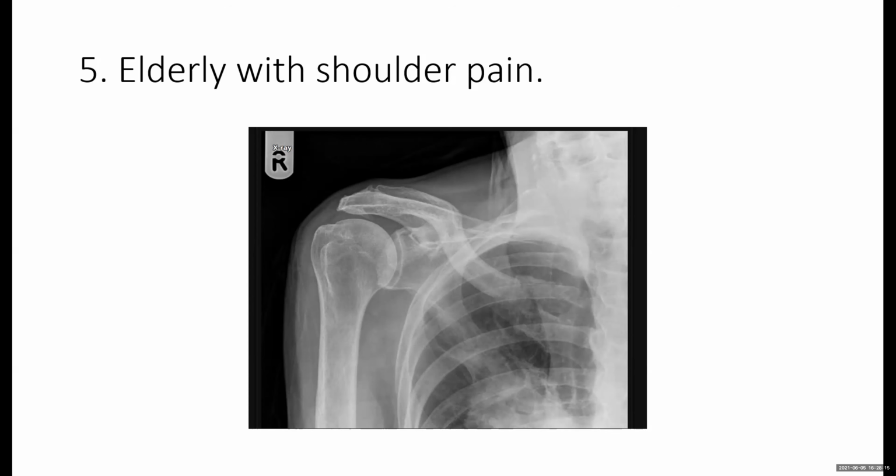Okay. Can you concentrate on the clavicle a bit more? Yes, oh, there is a fracture in the medial part of the clavicle, and beneath the fracture there is irregularity or radiolucency. It could be a pathological fracture, and with such a mass, I should think of metastatic lesion to the clavicle with a pathological fracture due to chest or lung CA.